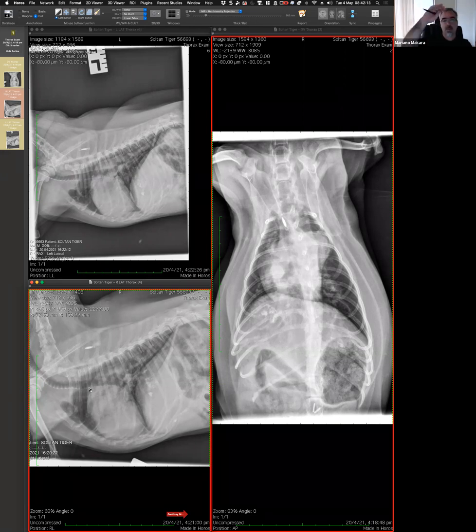So the blood going from the left ventricle goes into the aorta. Part of that goes to the body. Part of that comes back to the lung and back to the left. So then there is a volume overload on the left that looks radiographically as enlargement of the left atrium. Remember, left auricle, and then we had that bulge at the level of the aorta, that was the ductus, a young animal with a murmur. So that's the classic. Now we have a completely different picture in this case, but we know that there is a PDA. So I want you to take that and move on.